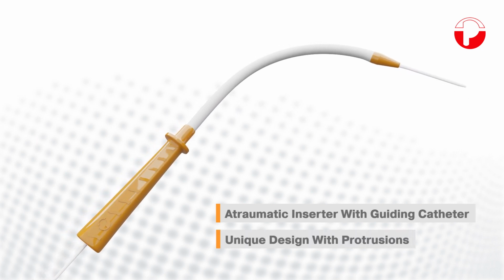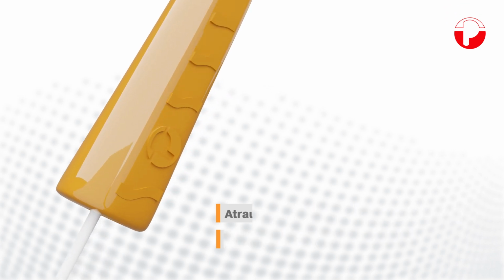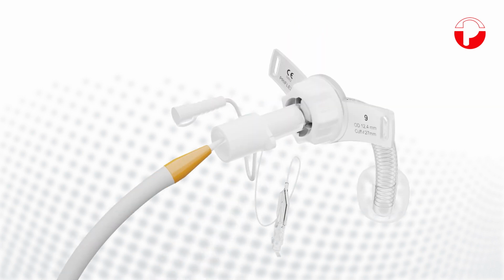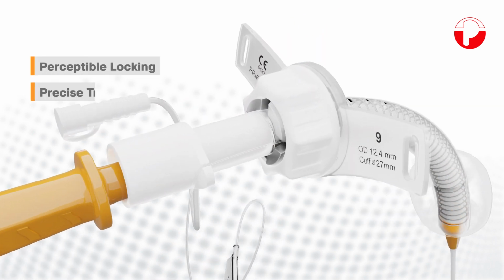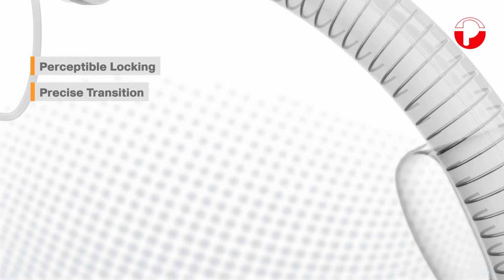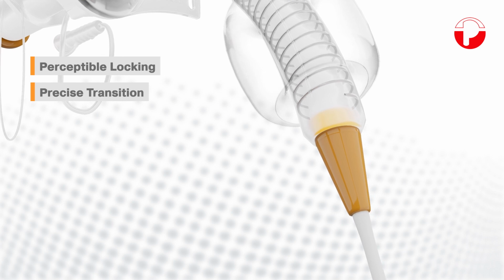It features a specially designed handle with incorporated protrusions, which guarantees secure handling. Each inserter is matched to the specific tube size. It snaps securely into the cannula. This ensures a precise transition to the tube tip, which permits atraumatic insertion.